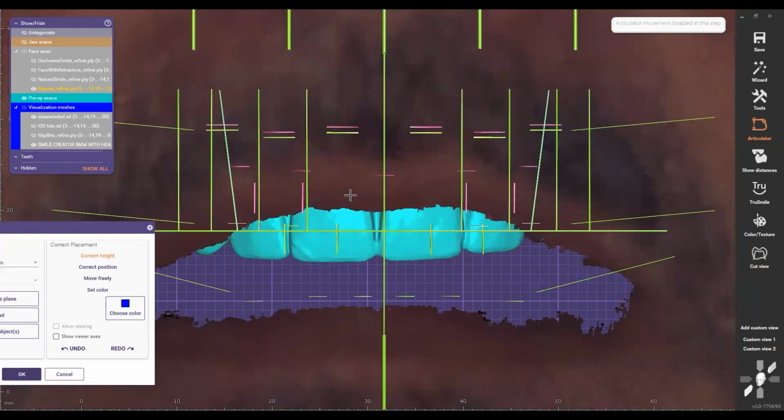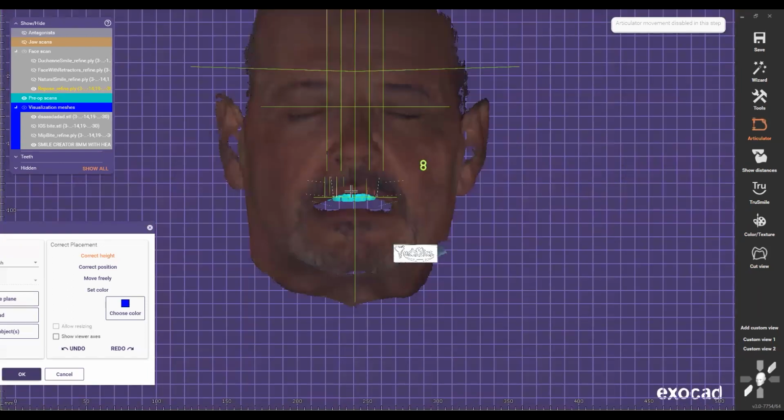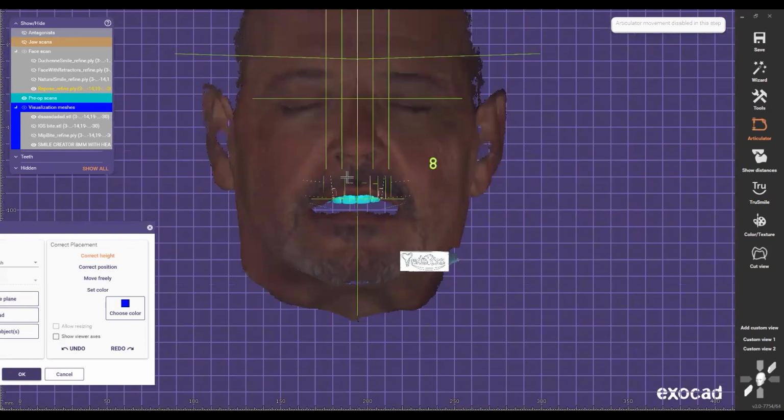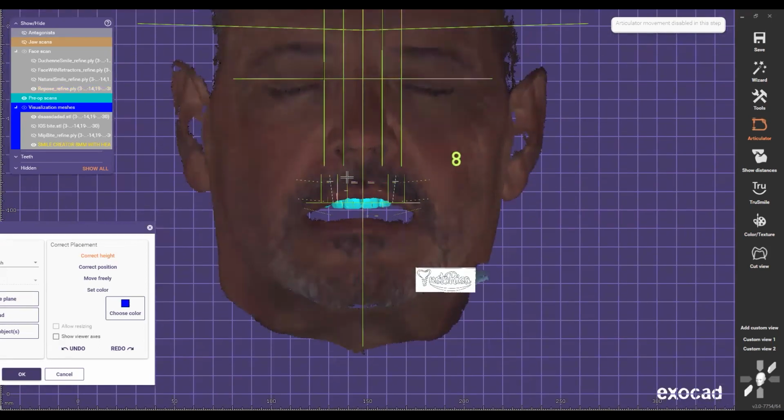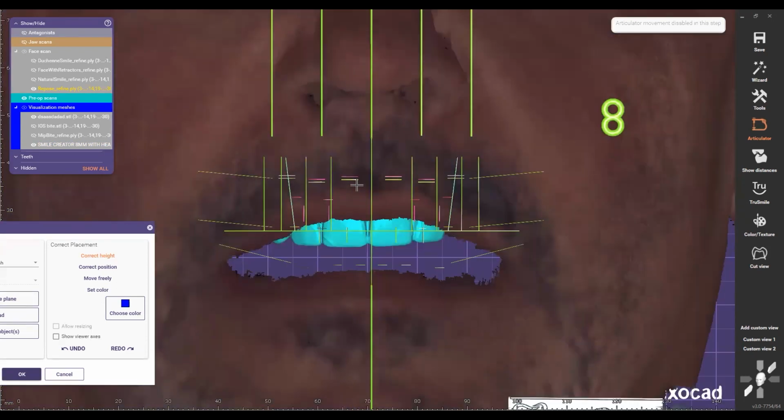But not only that, I have to visualize, because this patient is probably 50, 55, still young, right? The muscle of the lip is there. If it's a 70, 80, 90 year old, then I wouldn't focus too much on the repose. I would focus more on the Duchenne smile. That's one of the benefits that facial scanners provide me.